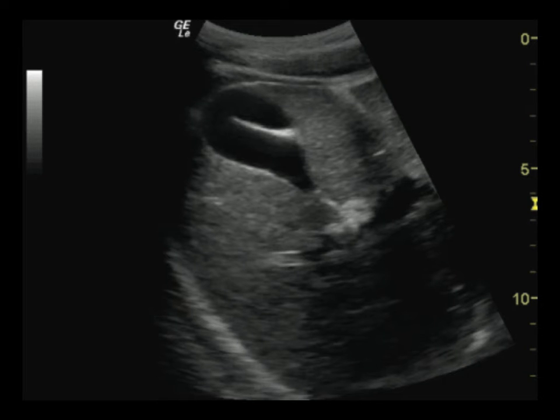How about this? This is described as a linear hyperechoic structure within the gallbladder. Again, we see absence of shadow. And this is just an example of a gallbladder fold. Earlier I mentioned when looking for stones, we can often see the shadow even before we can see the stone. What do you think about this image?